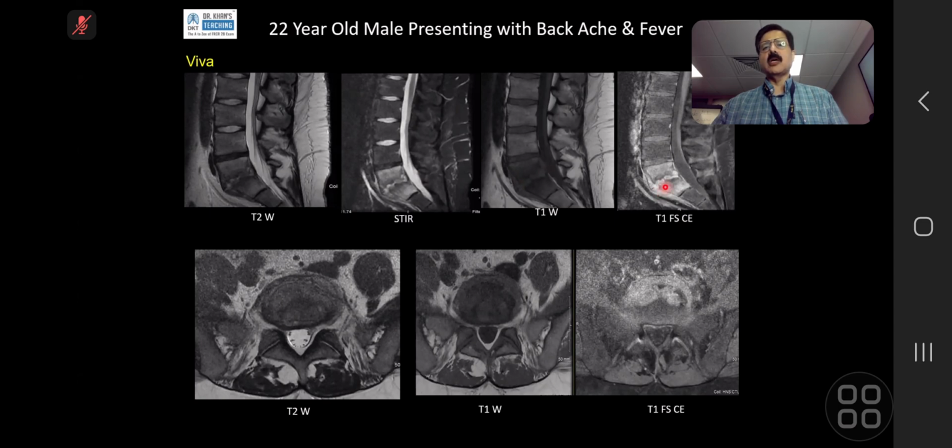So please remember that when it is enhancing, it means there is no liquid component and it is still what we call a phlegmon. And bone marrow edema will also show you enhancement. The candidate did very well. We have ruled out anything happening within the thecal sac. So use the word spondylodiscitis, elaborating that the disc as well as the adjacent bone is involved.